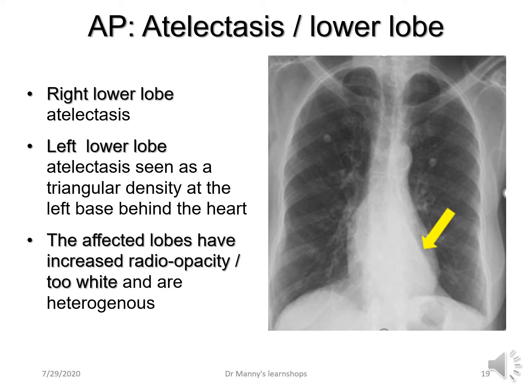But typically we would leave that for the radiologists to identify. They're the experts. The affected lobes have an increased radiopacity, they're too white, and it's a patchy whiteness, heterogeneous.